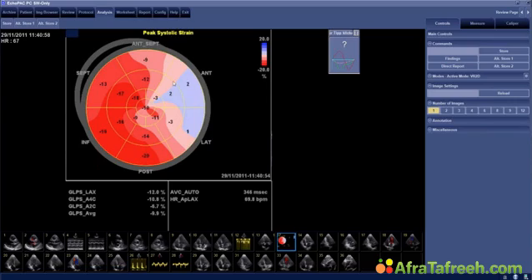And blue or pink or lighter shades of red would denote areas where we do not have normal contraction. Now, if you look at this, this is pretty amazing, because this is exactly what we see in the coronary angiogram. So we have the anterior wall, the basal and mid segments, but also the apical segments, the lateral wall, and the anterior septum. And as a matter of fact, the inferior wall looks quite normal, except for the apical region, but that is LAD territory, I would say.